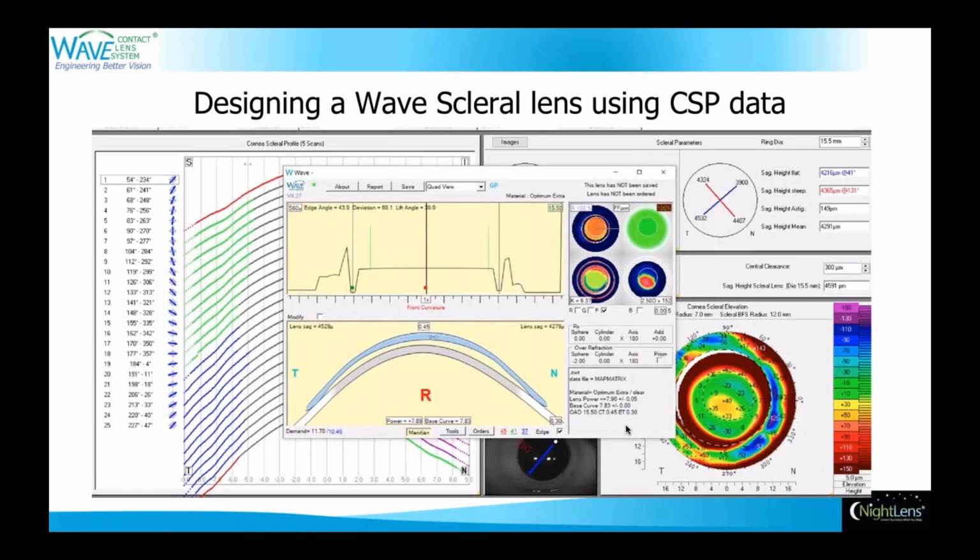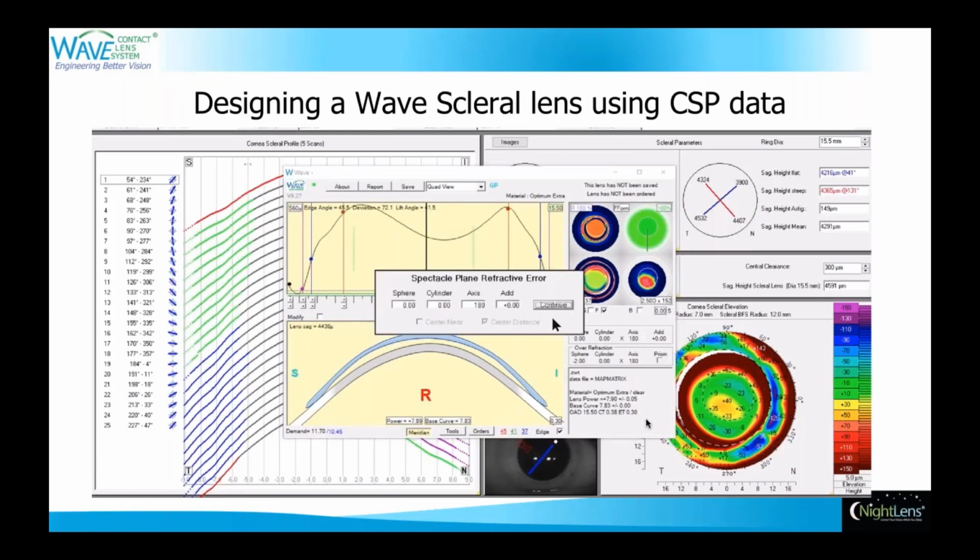We're here looking at the quad design at the front surface. And what I just did is I just reduced the anterior optic zone. Those are those green data points, those green control points on the front surface. And by making the anterior optic zone a little bit smaller, we've been able to make that plus 7.90 lens thinner.